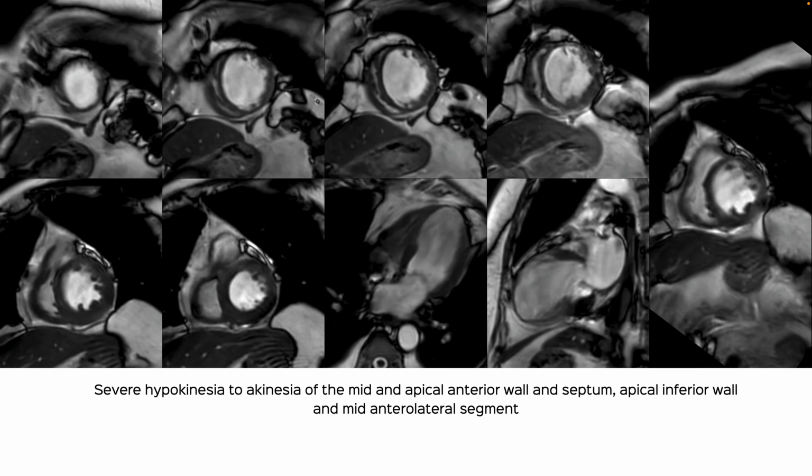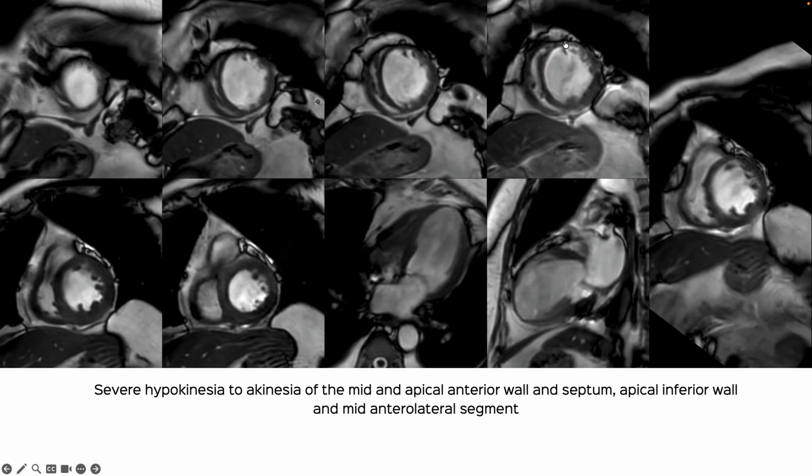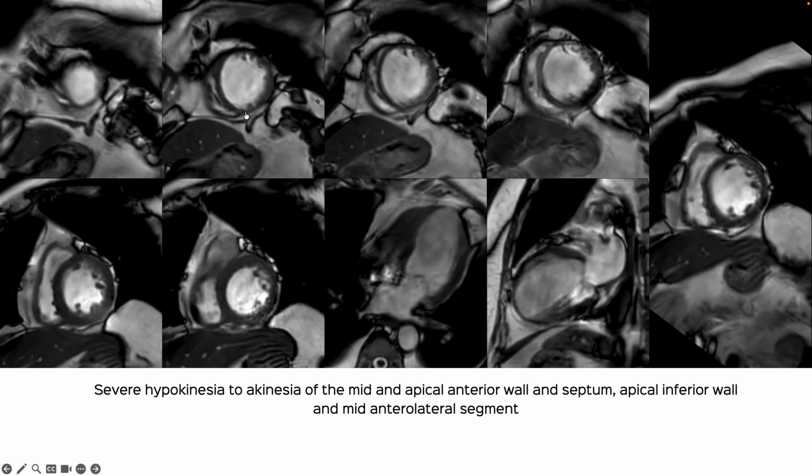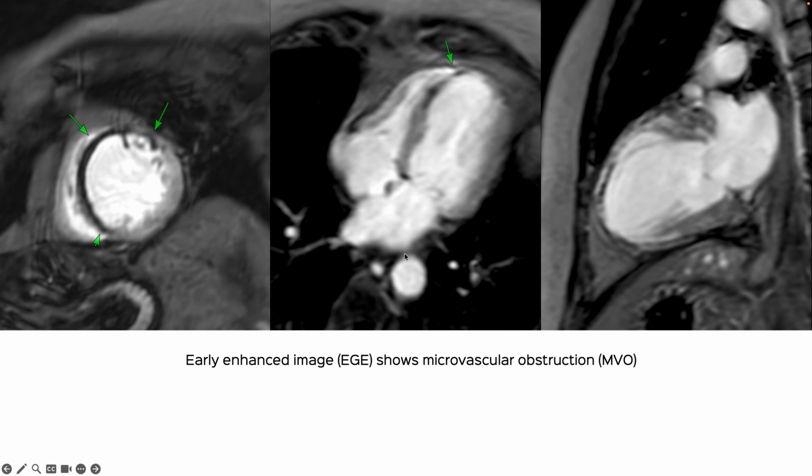And you can see here on the short axis that there's severe hypokinesia and akinesia of the anterior wall and septum and the apical inferior wall, which is consistent with an LAD territory. The circumflex territory shows normal contractility. And on the early enhanced images, we see this area that doesn't enhance at all in the LAD territory, mid-anterior wall and septum extending into the anterolateral segment. And this is classic microvascular obstruction in the early image.